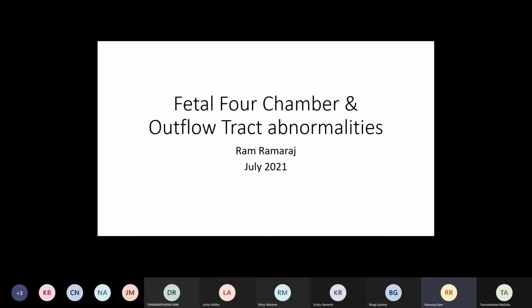So for example, aortic valve or mitral valve scenarios. If you see the excursion of the mitral valve is not good, or if you see a subtle LV/RV disproportion, then we bring them back at least a good 6 weeks apart to see, along with the fetal circulation, whether the chambers are changing, or the valves are developing into a more stenotic scenario. Yeah.